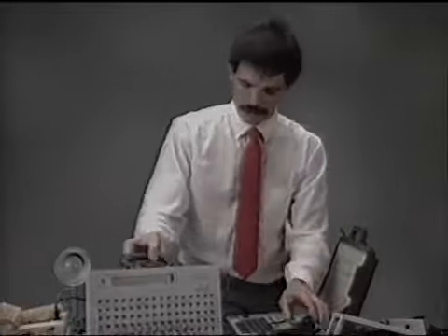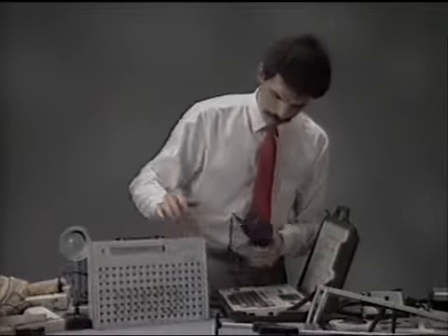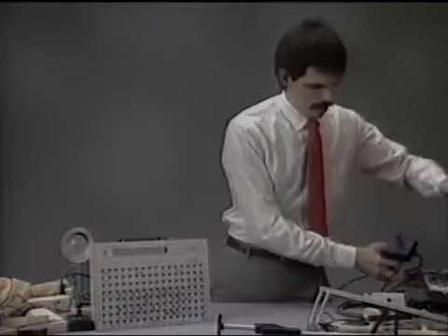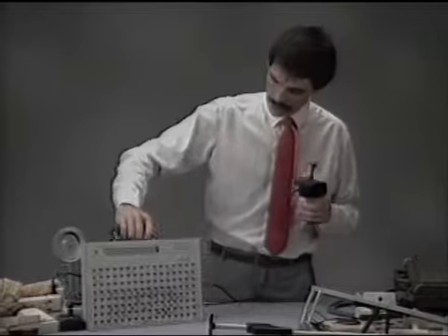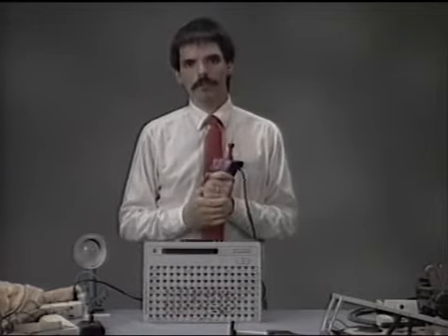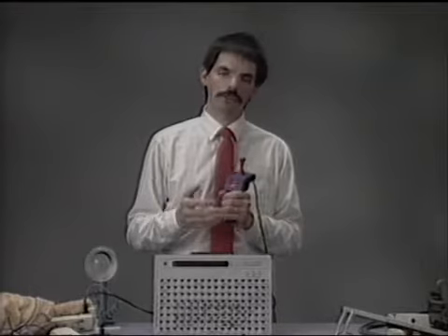By plugging this joystick in, I can turn it on. Let me move this one over to the side. This uses a symbol sequencing technique called MinSpeak. MinSpeak allows me to remember phrases in a little bit different way. It allows me to associate pictures with a phrase.